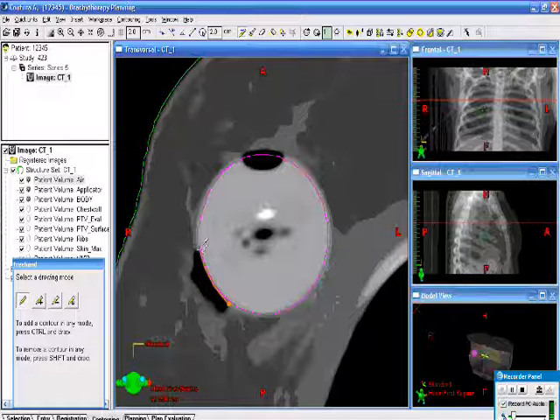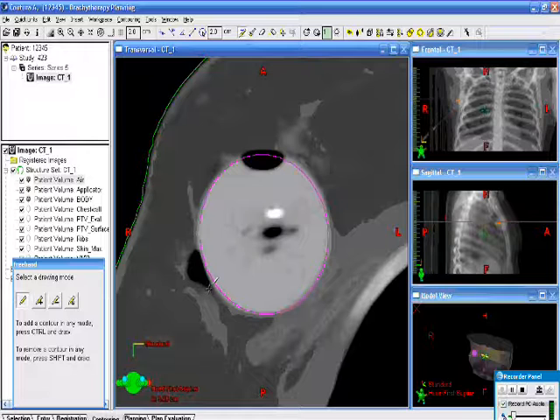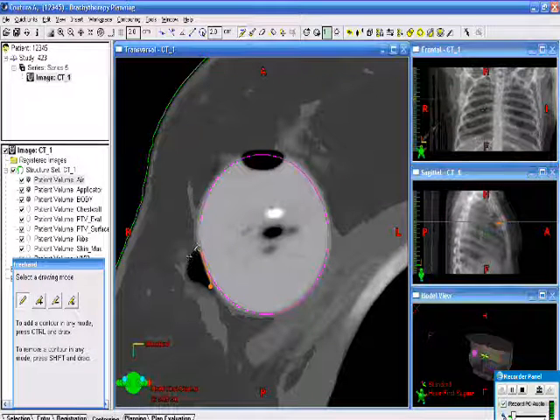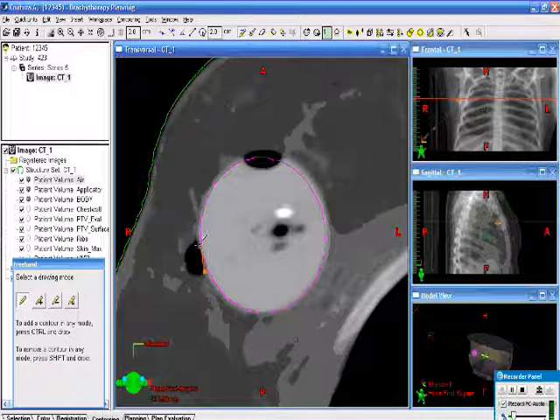And since there's not that much to draw, it's pretty easy. Now, if you want, you can draw it rather sloppily at the balloon margin and make sure that it goes inside the balloon when you do that, and then you can subtract the balloon from it to get a nice clean edge there. But in this case, it's not so hard, so we won't bother.